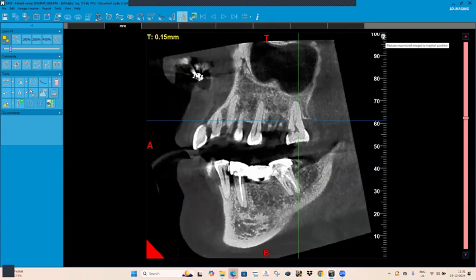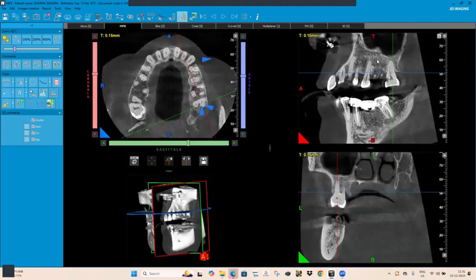So in some teeth, sometimes it becomes difficult for the Vertucci classification. Then we have to go for other systems. But usually we give the Vertucci classification only. Because sometimes we get some complicated morphologies in the root canals in some teeth. So at that time, either we just give that, like 1 to 1 class is like this, or we go for other systems. But in general practice, we give Vertucci classification only.